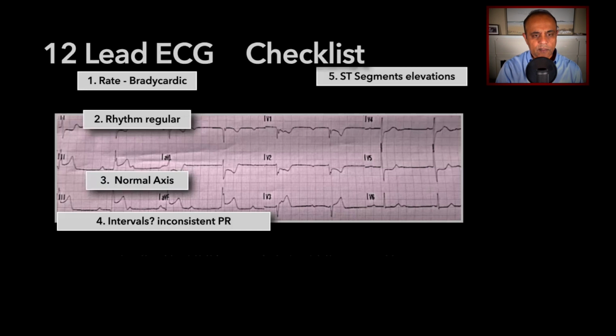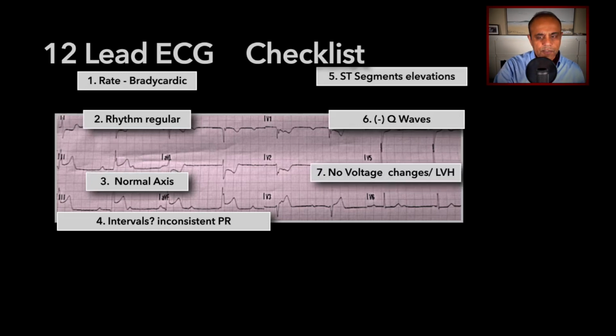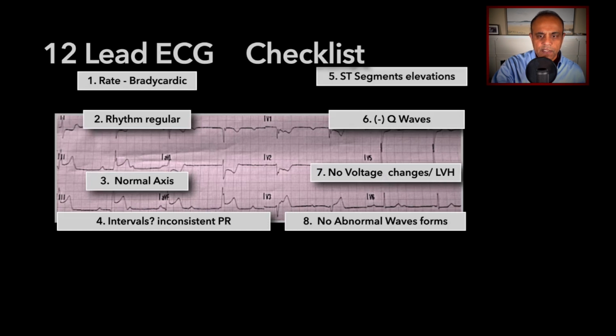ST elevations, well, if you look at the inferior leads, there are in fact some elevations. Q waves, I don't see any pathological Q waves of concern here. No voltage changes suggesting LVH, and there are no abnormal waveforms here either.